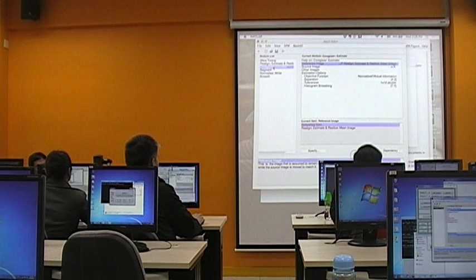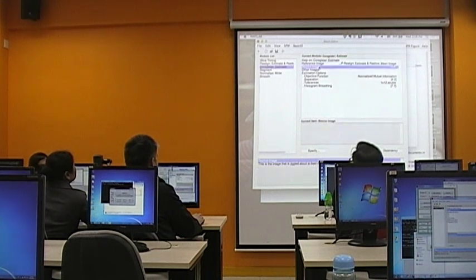And this mean image, then we are going to put in the source image, the high resolution T1 image, as the source, which means that you are going to move around that particular T1 structural image to match with the mean EPI, the functional image, so that you are bringing them to the same space.